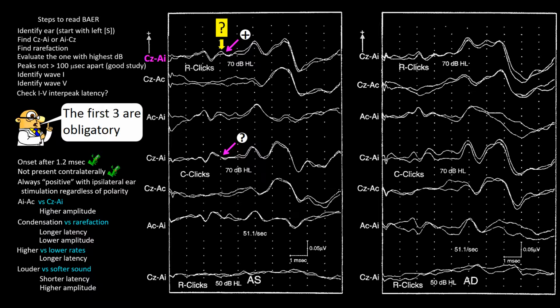This is a subtle difference, but it is nevertheless an important subtle difference. So, by the side of this criterion, I have placed a question mark.